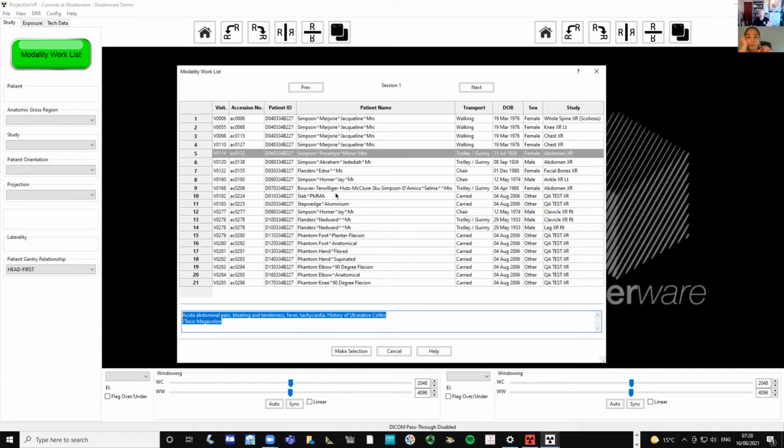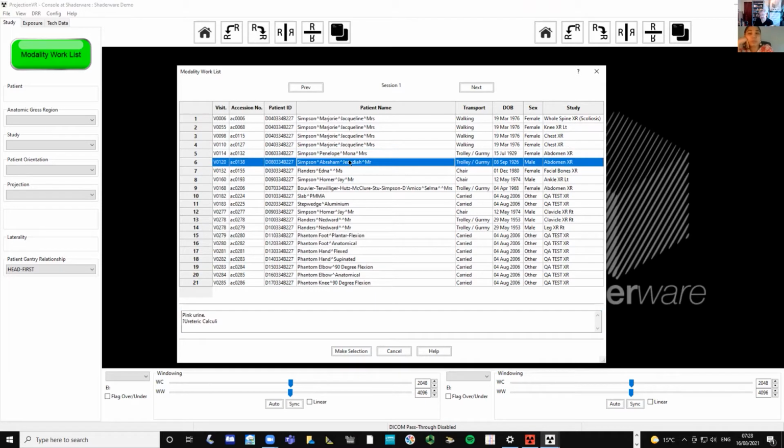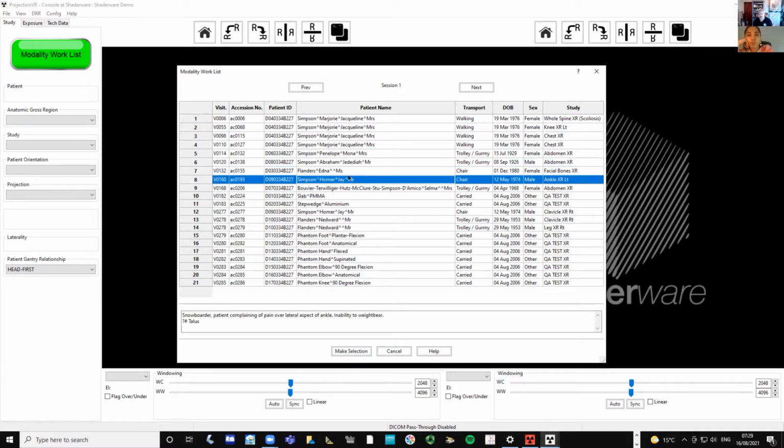Okay, but bear in mind that each time you x-ray any of these patients, you can repeat the x-ray on any one of them, and it's a new exam each time. It's completely different. So I'm going to pick this guy's ankle, for example. I've x-rayed him hundreds of times, but of course it's a new exam every time. So honestly, you could fill up a logbook by doing these exams every time. Right, the logbook. I'll show you.